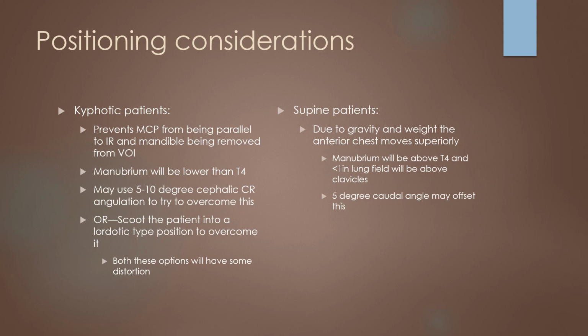Okay, some interesting other positioning considerations. We mentioned our patients that are very kyphotic. You might look at them and think, well, why don't they stand up straight? Or I'm going to have them stand up straight. And the problem is they just really cannot do it. So especially in our older years, a lot of us with poorer bone density are going to become more and more kyphotic. And when they do that, you might see a patient's head right down in their chest. So when we take their x-ray images, you're going to get chins right in their chest field.